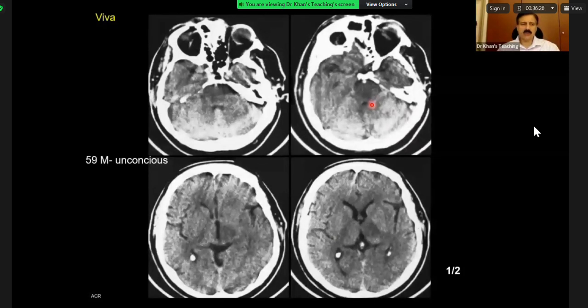I've shown you a case of leptomeningeal carcinomatosis, in which it was enhancing, meaning that was with contrast. But basilar artery thrombus is a very important exam case. It will always be subtle. In this particular case, the learning point is that initially, in the pons, you will always be in doubt, because there is a lot of artifact from the petrous ridge, and you will never be confident initially: is there an infarct there or not?